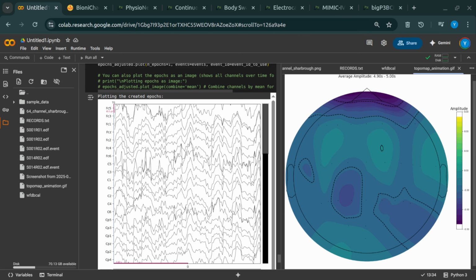It gave us that single teaser event, but stubbornly kept the rest of its secrets hidden because of that undocumented binary format. Right, which led directly into the Epoching saga, wrestling with no data errors, then the rejection thresholds kicking out our data. Until you finally made that breakthrough by temporarily removing the rejection criteria, just to create that one precious epoch around T0. Our first window.